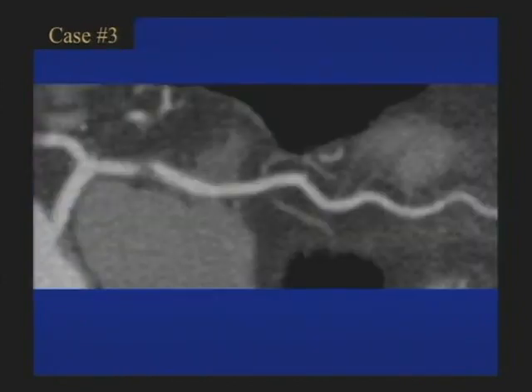All right. What kind of image is this? This is a coronary. This was a patient with chest pain and they got a coronary CT. So how have we reformatted this image? That'd be one question. What kind of reformat is this called? And then is this patient's chest pain due to coronary artery disease or not? And what should we do next?